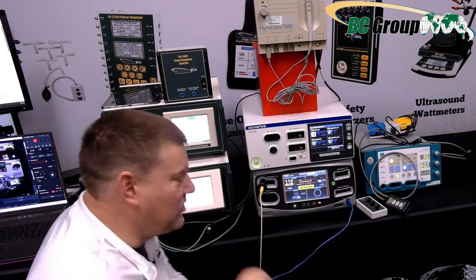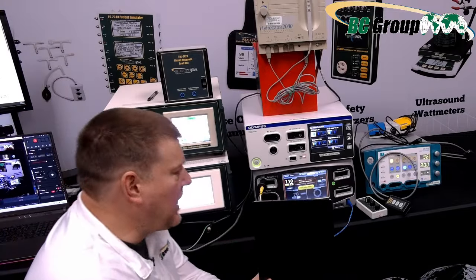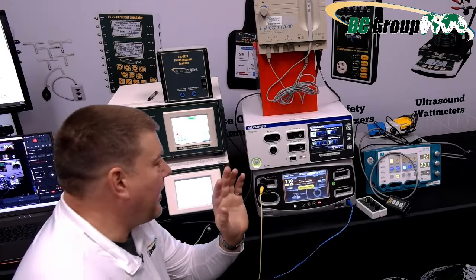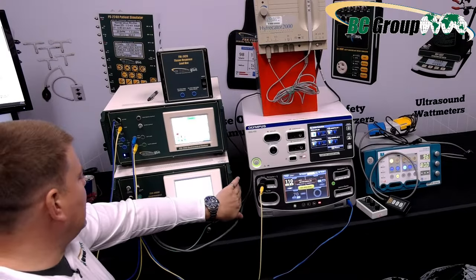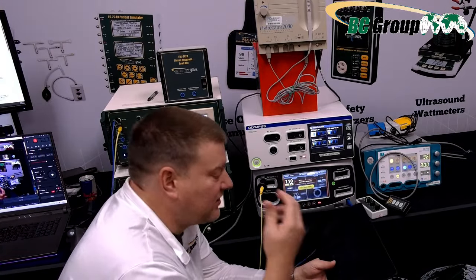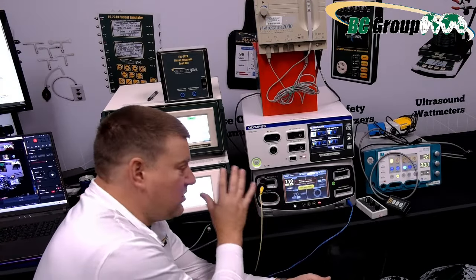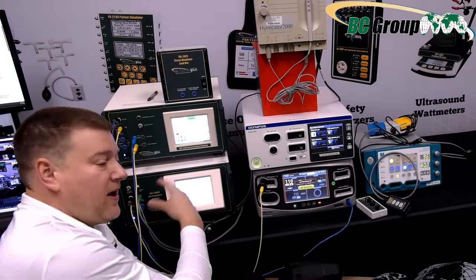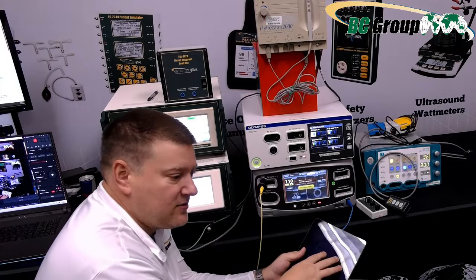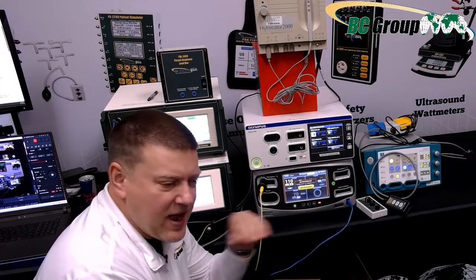And I saved the absolute best for last, guys. Oh my God, for you guys. Okay. If you guys are users of MyBC Mobile, we have an app that allows us to integrate the 2400 down here. So if you can imagine standardizing your test, which I don't have time to show you, unfortunately, but we can configure a test. So step 1, it'll configure your ohms, and all you got to do is follow the prompts for what cable has to connect to where, and you can include photos and checklists for what you're doing so that your biomeds are operating at the maximum efficiency.